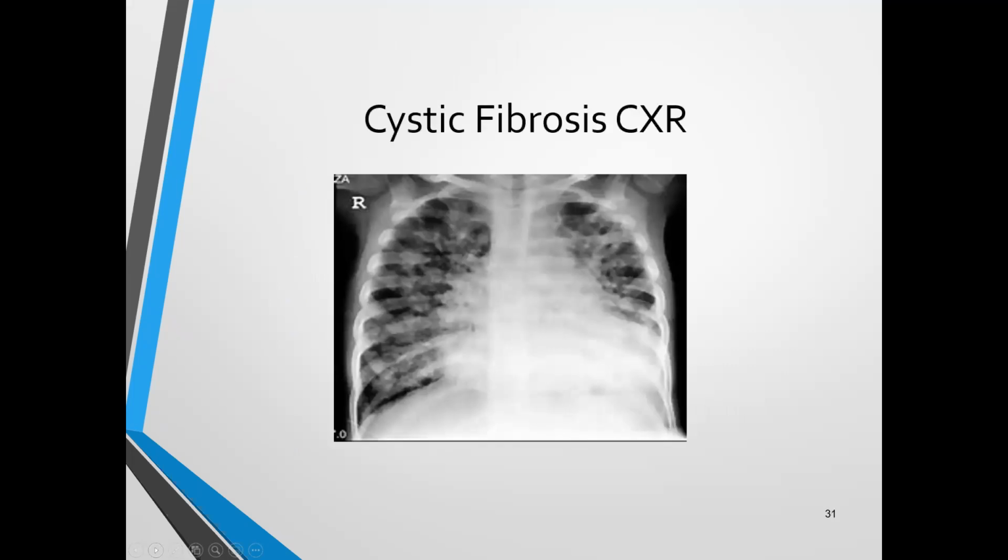This, crudely put, looks to be a 6, 7, or 8 year old, but really not good at all. What's really disconcerting is it's really diffuse, where the hilar regions really look bad. But then you also have these opacities occurring pretty much throughout the lung. So these lesions, infections, and scarring are pretty much throughout the lung regions, with this hilar region looking completely consolidated.